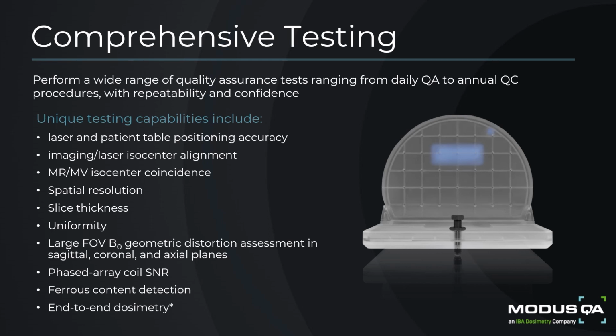So at this time, I did want to mention that these tests can also be conducted manually by using only the phantom, or it can be automatically analyzed through the Insight software, which I will touch upon more later.